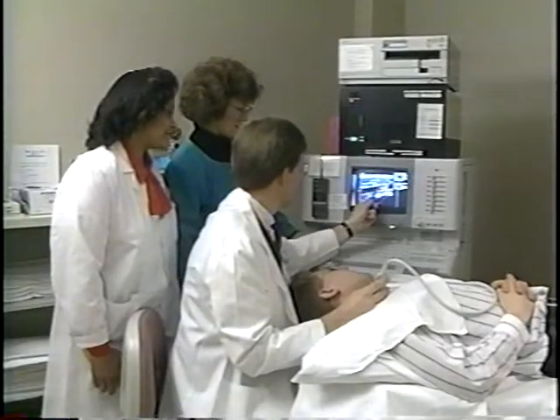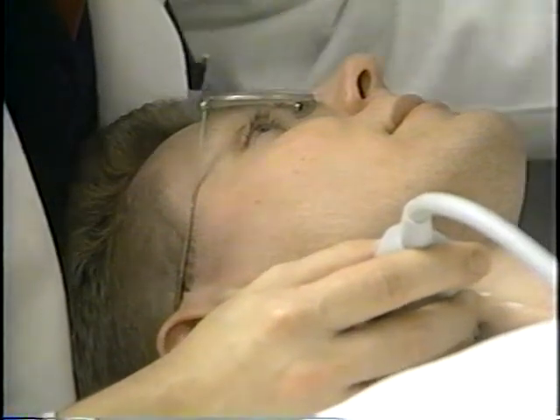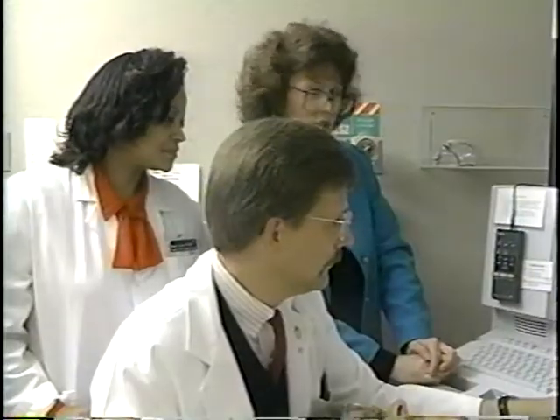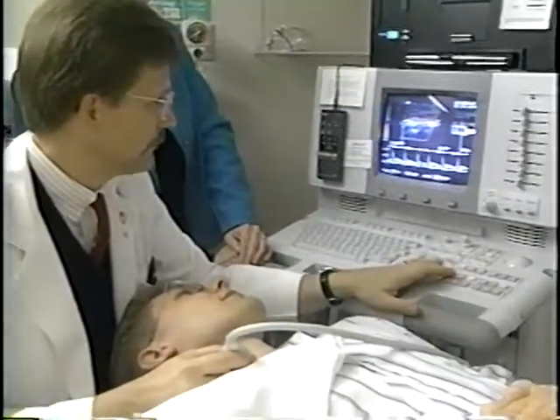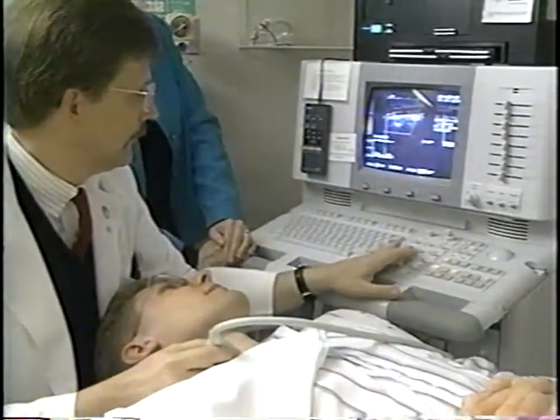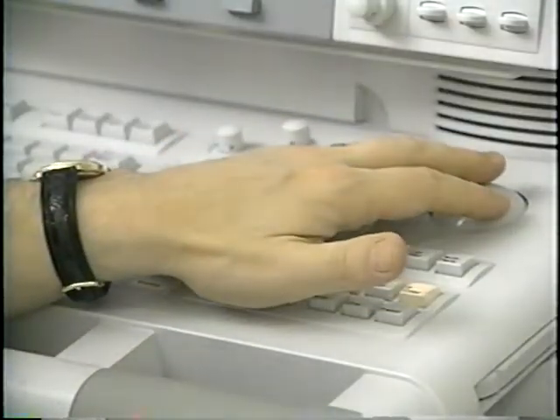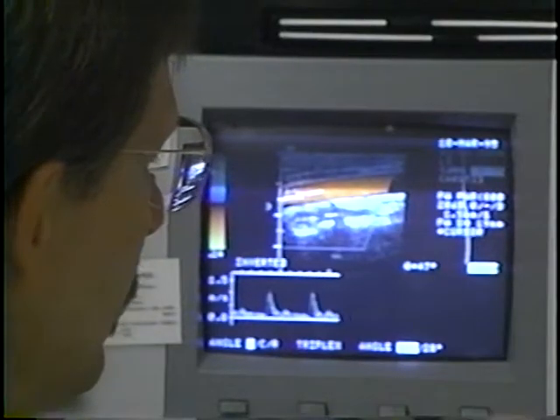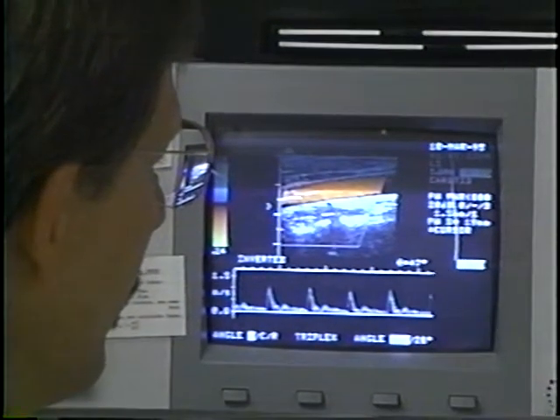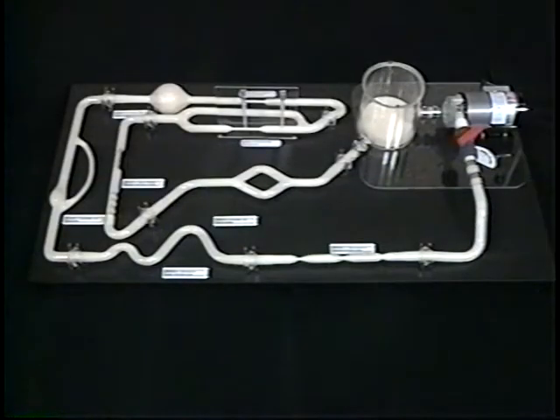Vascular laboratories must offer multiple diagnostic services to patients in a single setting. Consequently, vascular technologists, students, and physicians are being asked to learn and participate in duplex imaging studies. A thorough understanding of hemodynamics is essential to successfully perform color and spectral Doppler imaging. A model was created to provide visual and interactive demonstrations of frequently encountered hemodynamic states in the human body.